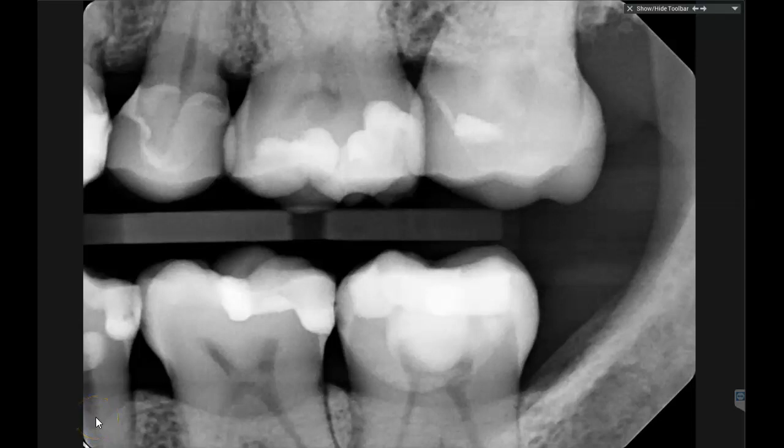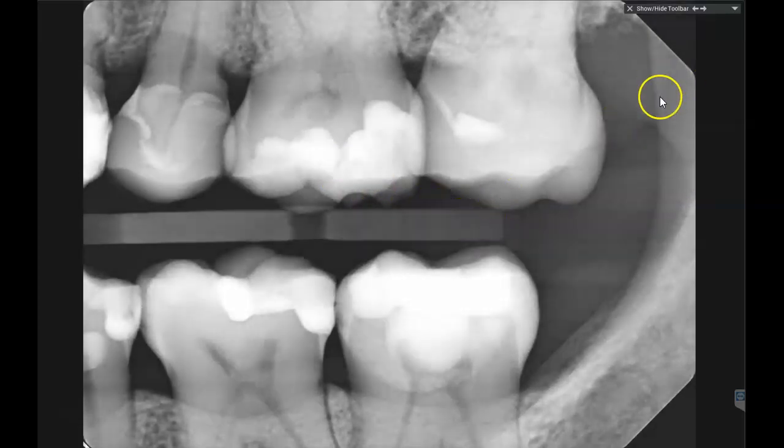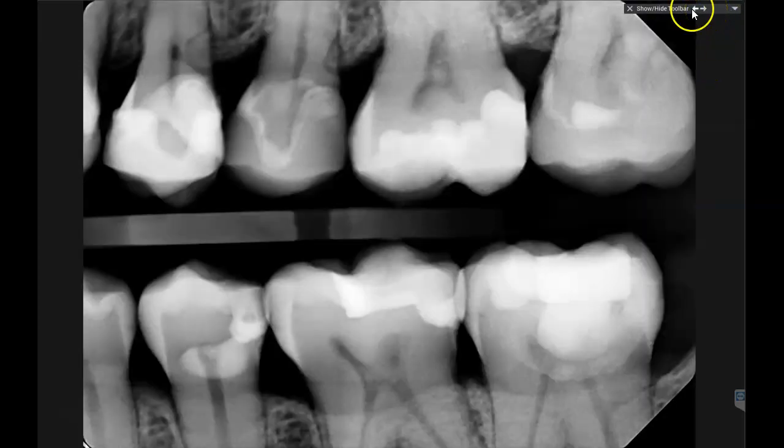It's interesting that at some points, whenever an image is loaded and the mouse movement is made to darken or lighten or change the resolution of an image, there's no response. So I'm right clicking, now I've got a response, but then if I go to a different image and do the same thing, nothing happens. Nothing happens on this image. I've just advanced to the next one.